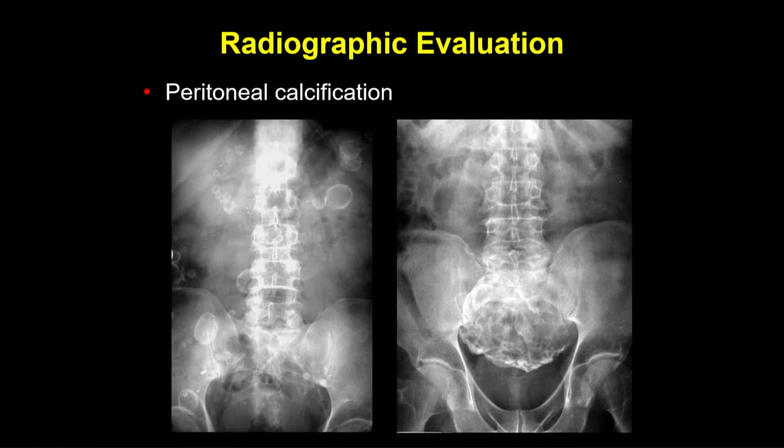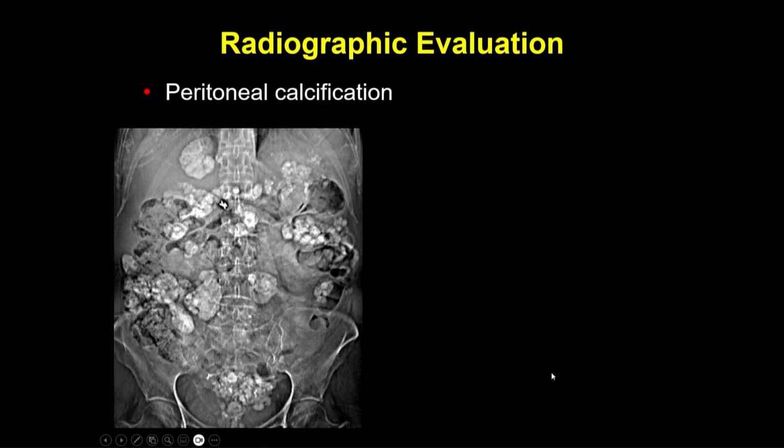In terms of calcification, another thing we can identify in radiographs, these are two patients with peritoneal echinococcosis, so hydatid disease that ruptured from the liver, spilled into the peritoneal cavity, and you can get multiple rim calcified lesions. This looks almost like just a degenerated fibroid, but it was a large peritoneal mass.